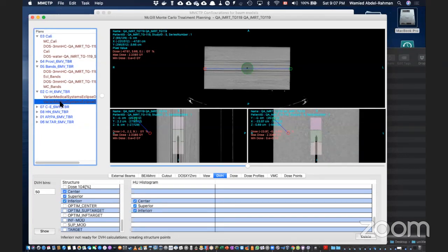If you're using a Mac with Catalina, I already know it's not going to work. But I have actually fixed this bug for Catalina, and it's working now on my computer. If you're using an older version, you should not have a problem. I haven't done it with Linux, but if you want to put it on your Linux machine, do it. Nothing should prevent you from doing that, and you should report the bugs, and we will fix the Linux version. Not a problem.